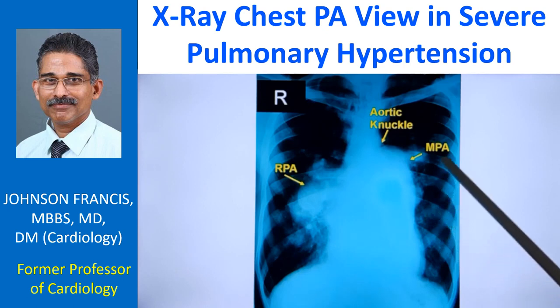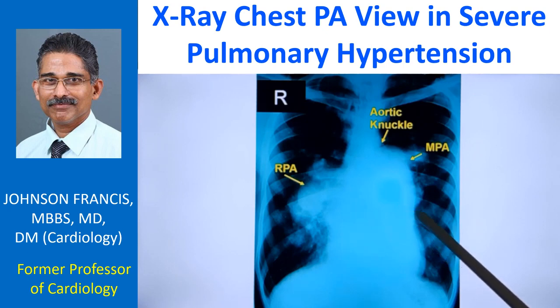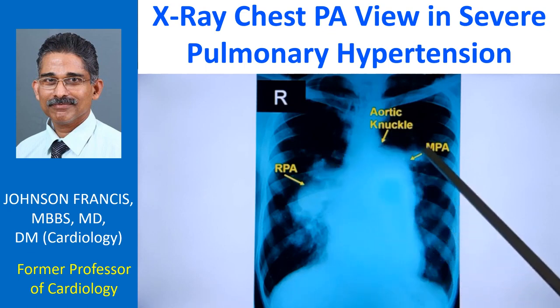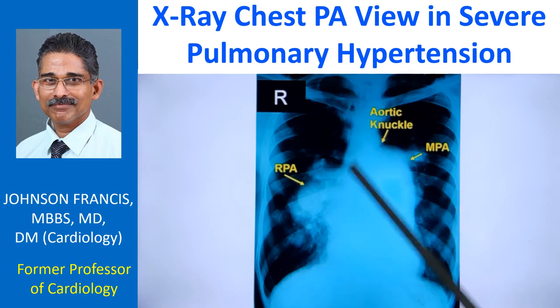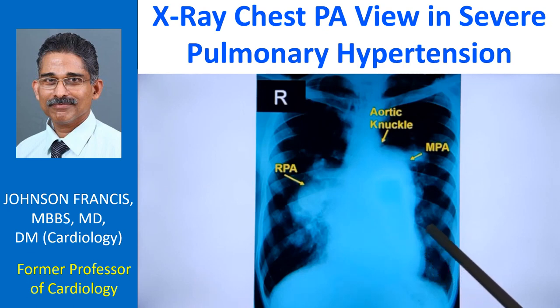The possibilities here would be severe primary pulmonary hypertension versus atrial septal defect with severe pulmonary hypertension. As these are not definite end-on views, this could be an end-on view of a branch pulmonary artery. If multiple end-on views are seen, then it is strongly in favor of atrial septal defect with a large shunt later going on to pulmonary hypertension.